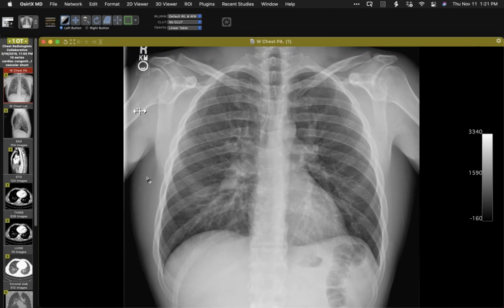Giving you a moment to look at that, I hope that folks can appreciate that the pulmonary vessels are not normal, they are distended. And the vessels that are distended are the pulmonary arteries. And the question is whether, in addition to the pulmonary arteries up here, and of course that can be hard, we also have distended pulmonary veins.